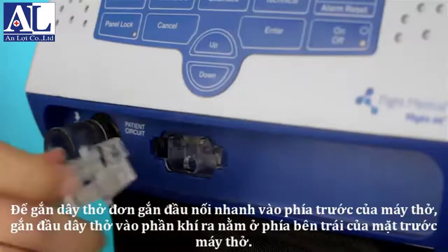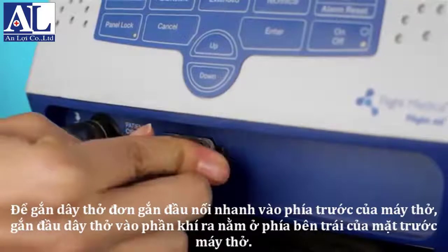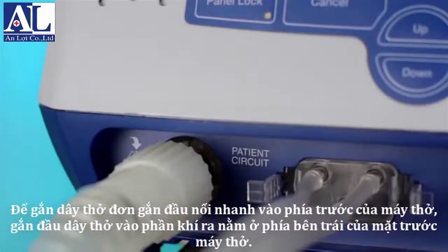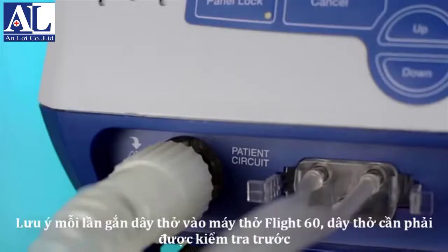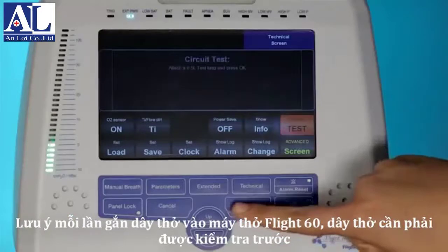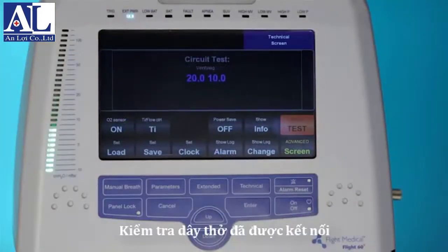To attach a single limb patient circuit, connect the quick connector to the front panel. Attach the inspiratory limb to the gas output on the left-hand side of the front panel. Please note that every time a patient circuit is attached to the Flight 60, a circuit test needs to be performed. The circuit test verifies that the patient circuit was successfully connected.